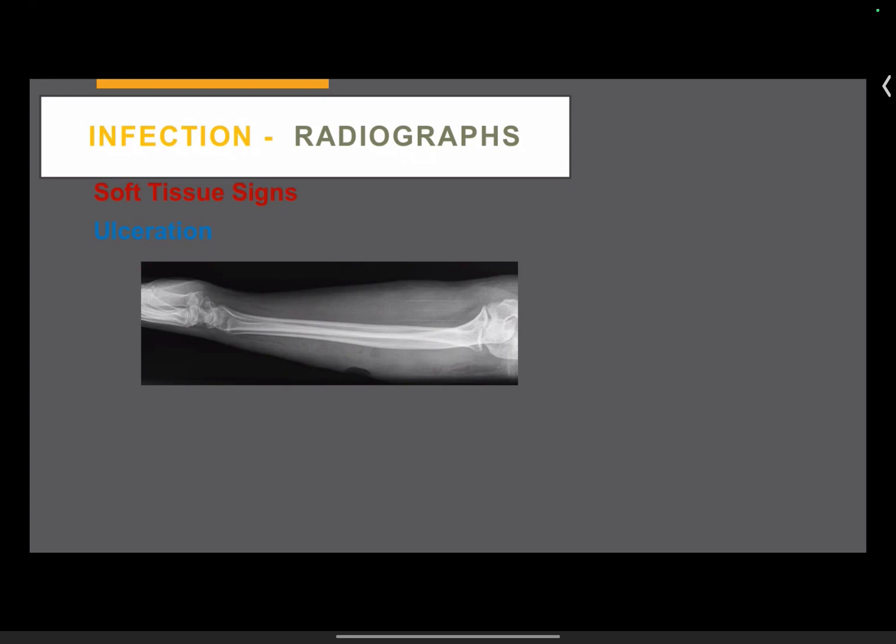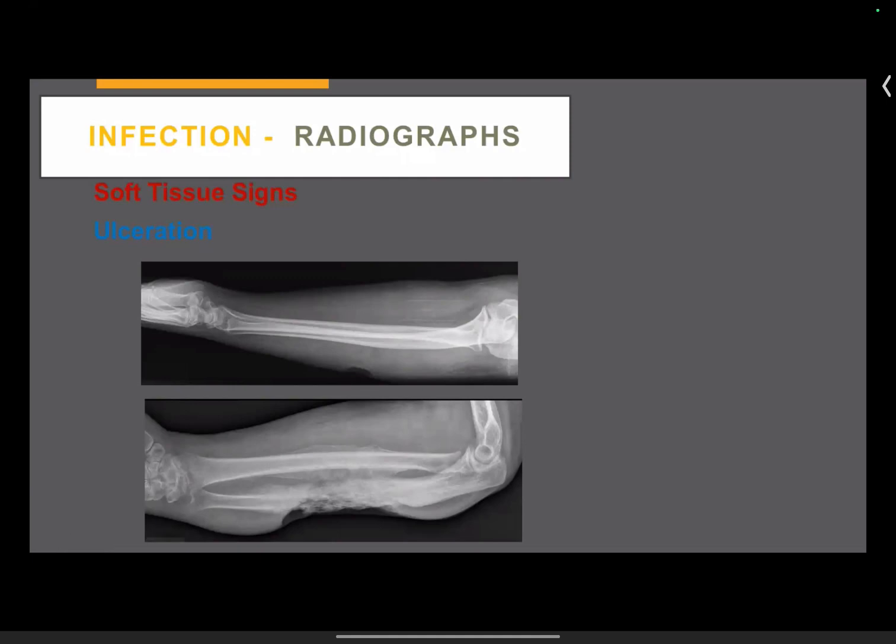Like this patient, a young lady on a motorbike, had an ulceration there, came to ER, but then left. Then a few months later, she presented with this. And then you can see on this, this has gone to the bone with that reactive new bone. It has gone across. If I tell you now, she's still got the limb, but she has lost one bone. They have to reconstruct the ulna with the radius, and she's a young lady.